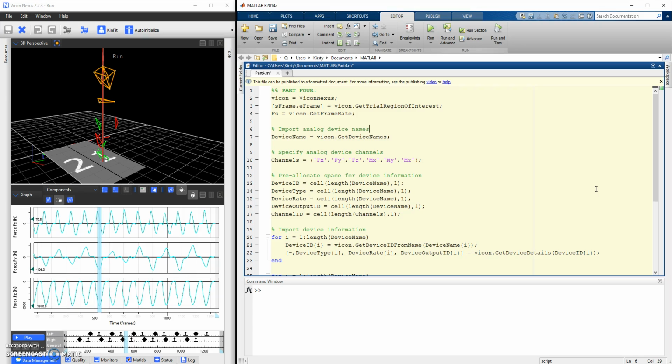I've kept it really open, in that the inputs that I need to bring in for certain statements, I haven't just listed by going into Nexus. I've actually automated the process, so I've taken them from Nexus as well and then input them in the next step. So you'll see what that means in a little while once we start progressing through the script.